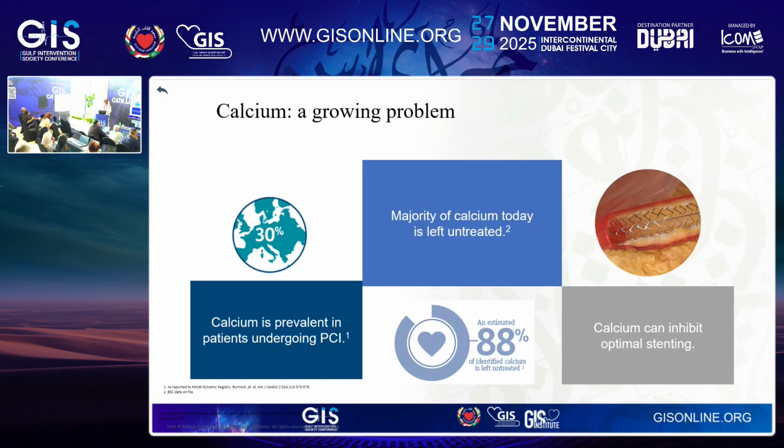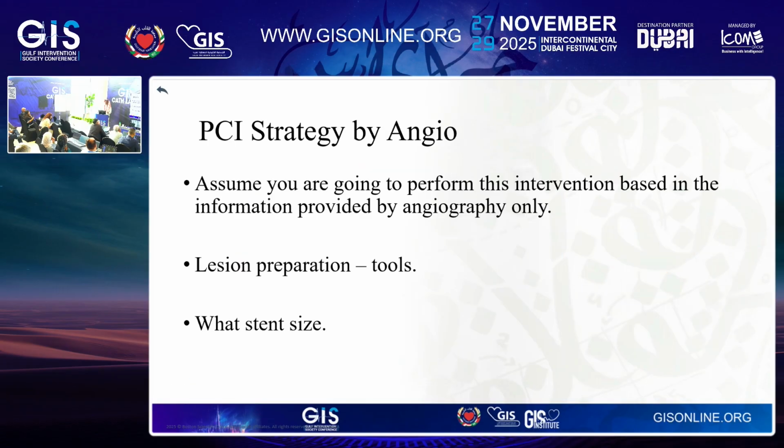So calcification in the literature has been clearly shown to increase the risk of a PCI. That is fact. It increases the complexity of the PCI. So our job is first to identify whether or not I'm dealing with calcification. Second, what I'm going to do with the calcification. There are so many pathways, and there are some recent data published from TCT, but you could choose whatever way you want to use to modify that calcification.